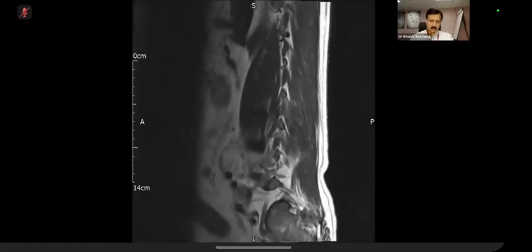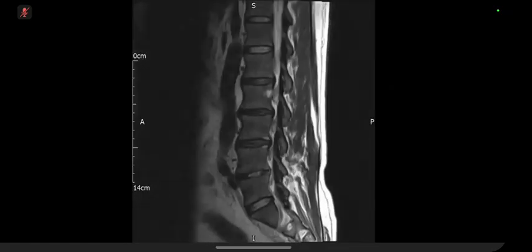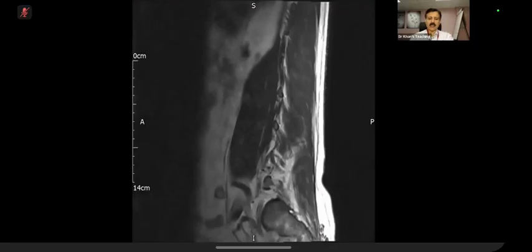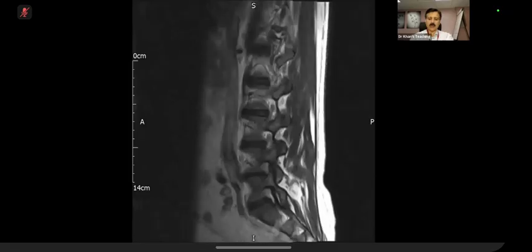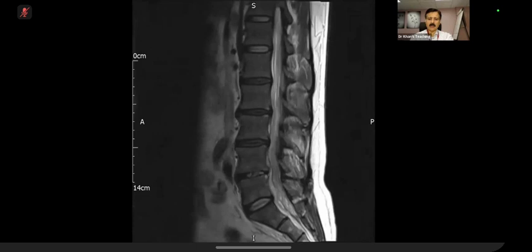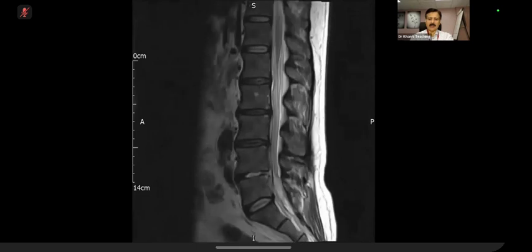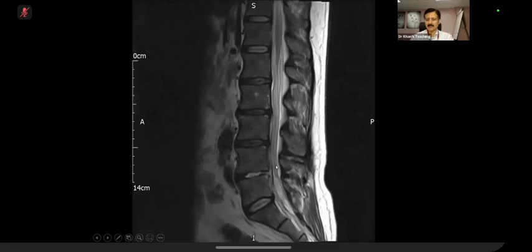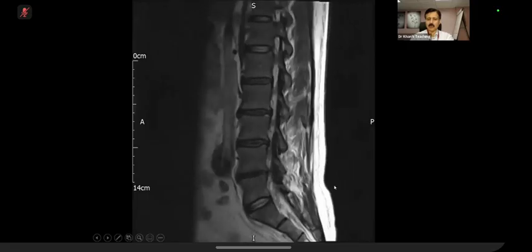Keep going. Okay. So this MRI T1 weighted. T2. This is T2. Sorry, T2. Okay, can you go to the midline, please? Just midline where the cord is visible. Yeah. Just stop here. Okay. Now, regarding the cauda equina, what do you think? There is increased signal in the cauda equina nerve roots on this image here. Right? Agreed? Okay. Please continue. Keep scrolling.